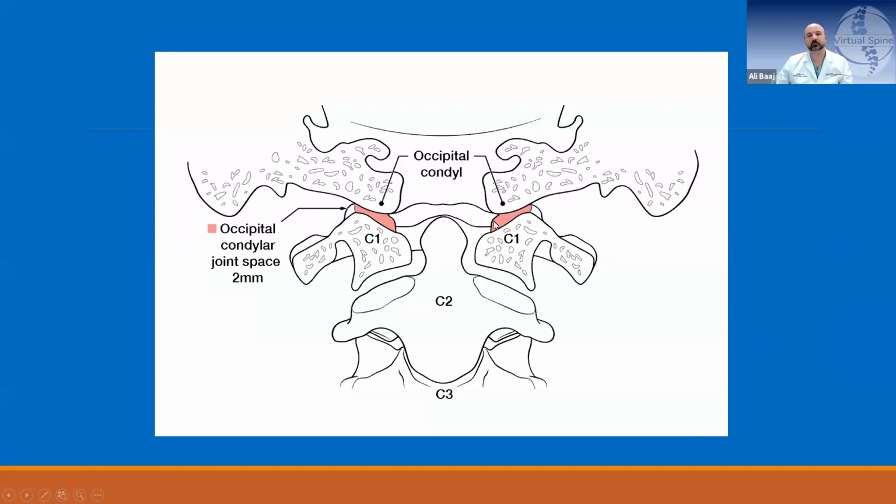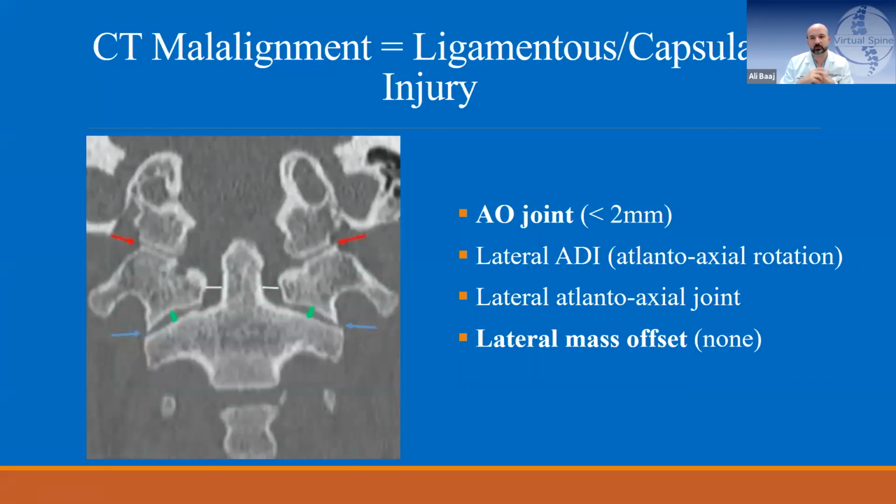Hi, sorry to interrupt. Just a quick question on that last image. This is a question for you and for Jonathan and anybody else who wants to chime in. Occasionally we'll get somebody who has a trauma and everything is quote unquote negative, but then you look at the CT, you look at the coronal, and you see that asymmetry.